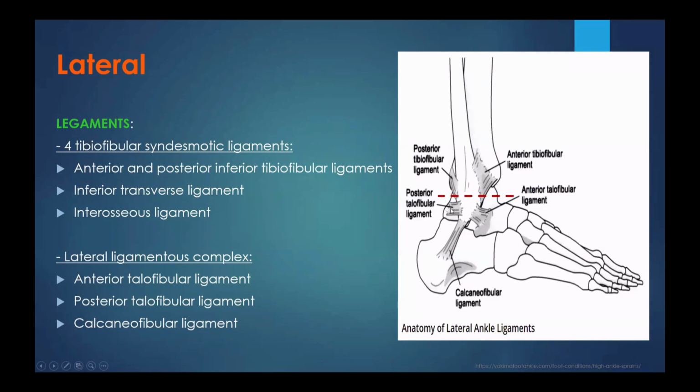The other group, which is lateral ligamentous complex, will be lower than the syndesmotic ligaments and communicate the talus with fibula and calcaneus with the fibula. And they are anterior talofibular ligament, posterior talofibular ligament, and calcaneofibular ligaments.